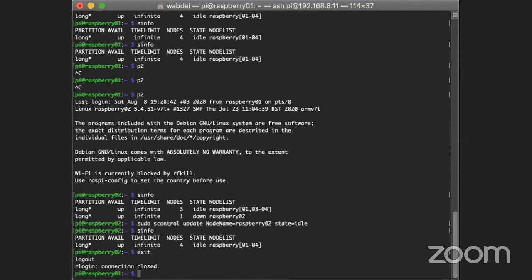Okay, so before we do the MMCTP, one thing you have to make sure of: I'm going to assume you have an Ubuntu computer. It doesn't need to be a cluster, but at least a single computer where you can do multiple parallel processing. You need to be able to access it remotely through SSH, which is usually available by default. You need to, of course, know the IP of the computer.